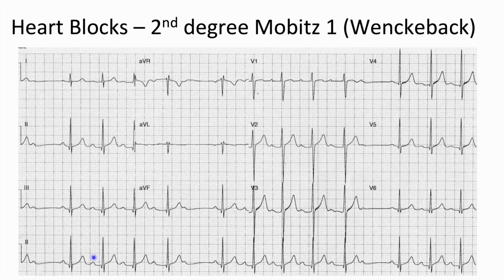And so what this is commonly described as is like going, going, gone. So you have a progressively enlarging PR interval until you suddenly drop a heartbeat. And then it starts over, small, longer, drop. And so that's what you want to look for. If you're counting the PR interval, you'll notice that it's small, getting longer, and drops. I've heard people say going, going, gone is Mobitz type 1. So that's what you want to look at for second degree heart block type 1.